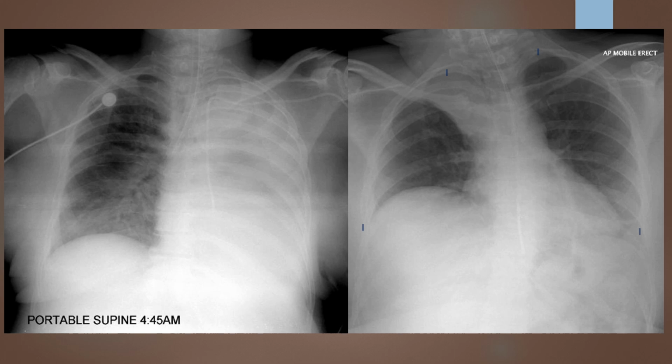Third, we're going to go ahead and evaluate our technique to see if this is even adequate to consider much further. So if I look here, I'm looking for soft tissue detail, bony trabecular pattern, and good tissue penetration. So here I do see that I have tissue penetration through the thickest part here in the mediastinum, where we see the heart overlapping the T-spine. I like my grayscale. I have good soft tissue detail. We're seeing good lung markings, so that means I have an adequate grayscale.